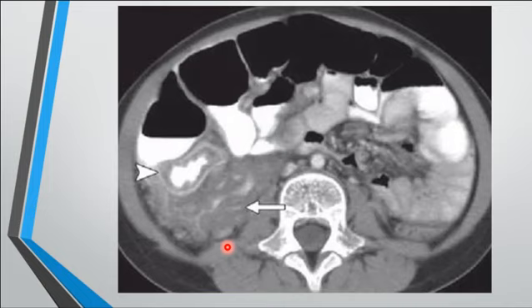This case is very interesting. It has a neurofibroma here, a big one, with adjacent thickening of the cecal wall from neurofibromatosis type 1. It's not an easy one, but it is a nice case to be seen. This is not reactionary, it is by itself, part of neurofibromatosis type 1.